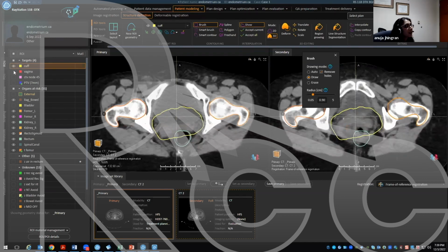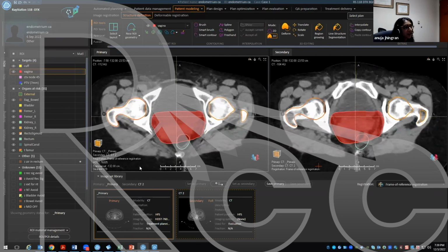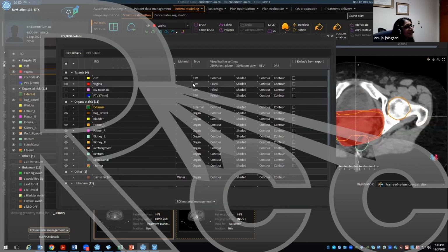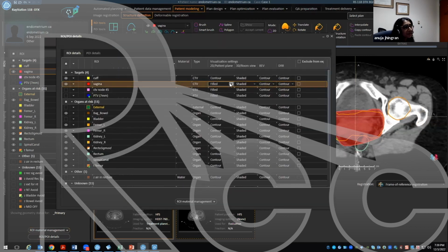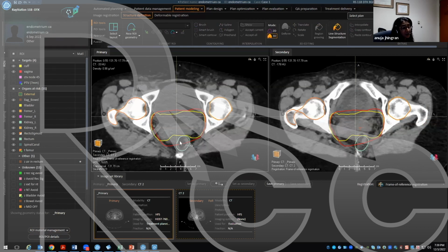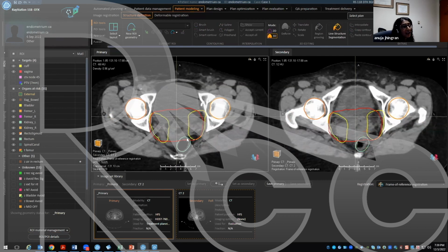So let's see if I really did that. I did this before and I actually changed it multiple times because this is a hard case. I actually went even lower on this case, and I went higher on my ITV. But if I was doing it again, this is how I would do the yellow instead of the red.